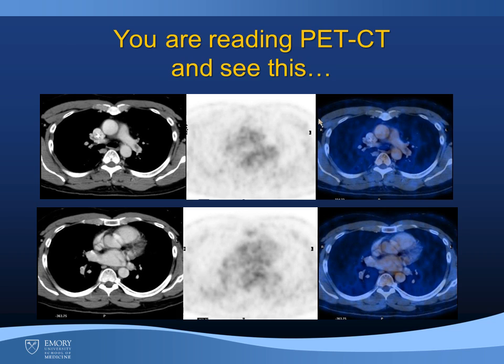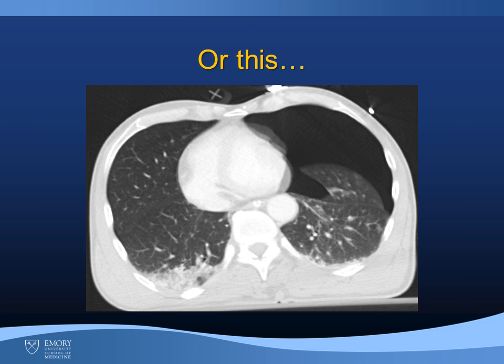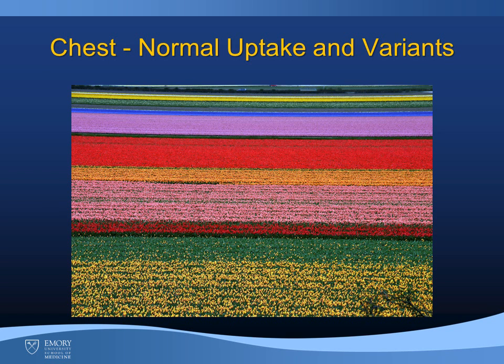Let's start with a couple cases. You're reading a PET-CT and you see this, or this. We'll be discussing these cases and more during this talk. First, let's deal with the chest.